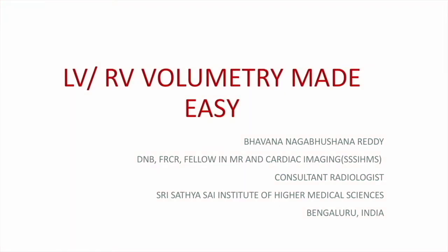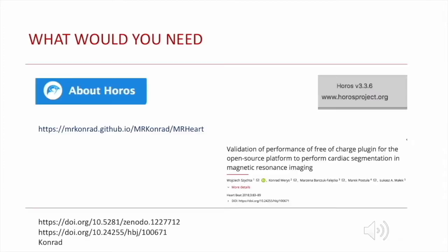Hello everyone, I will be demonstrating how to perform LV and RV volumetry. CMR provides a wealth of information about quantitative evaluation of both LV and RV. Not all of us may have access to this. If you have a Mac, I would suggest a simple way of doing this. Download and install Horos, which is a free open source medical image viewer. Download the latest version, that is Horos 3.3.6.